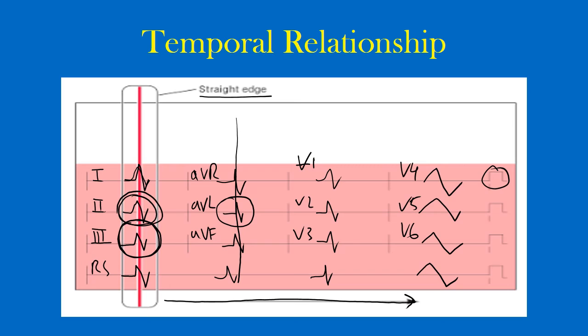and could actually save a patient's life. So make sure you have that rhythm strip when you're interpreting EKGs. So that's that one here in the bottom. Make sure that's there when you're interpreting any of these EKGs.